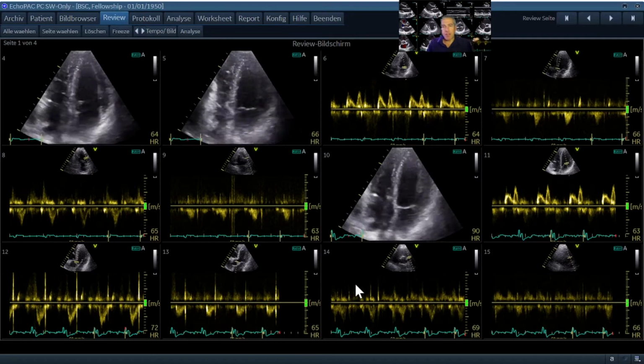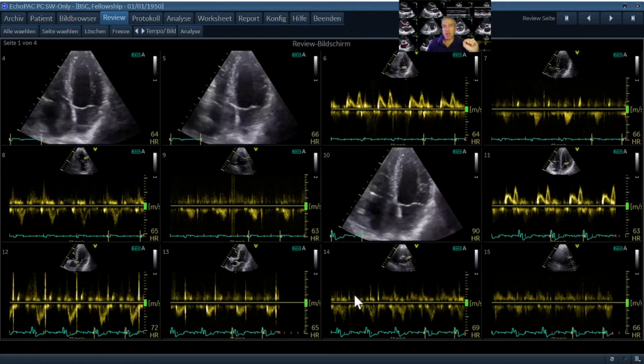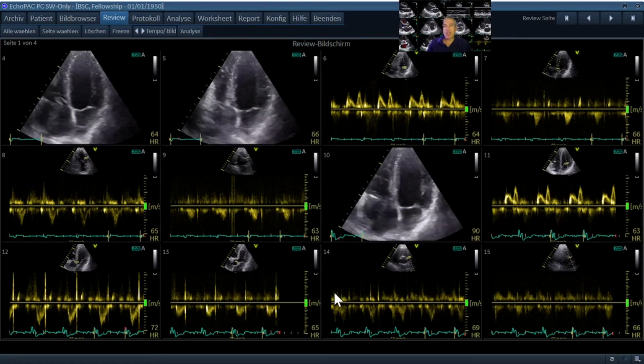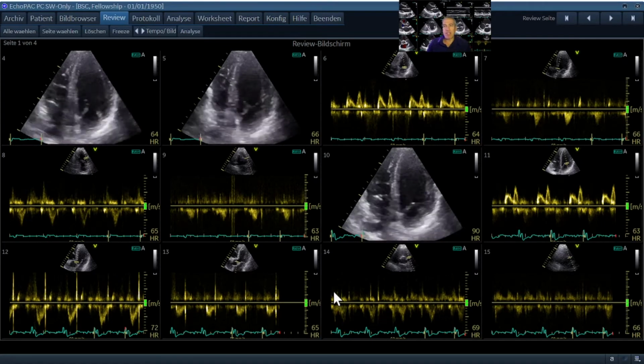And one of the fellows knew the patient from his hospital, and she told me that they optimized this patient by the ECG. So they obviously looked at the QRS width, they looked at vectors, and they were happy with a programming with an interventricular delay of 40 milliseconds left ventricular pre-excitation. So he came with a VV delay, as we say, minus 40 milliseconds, where the left ventricular lead is pacing 40 milliseconds earlier than the right ventricular lead.